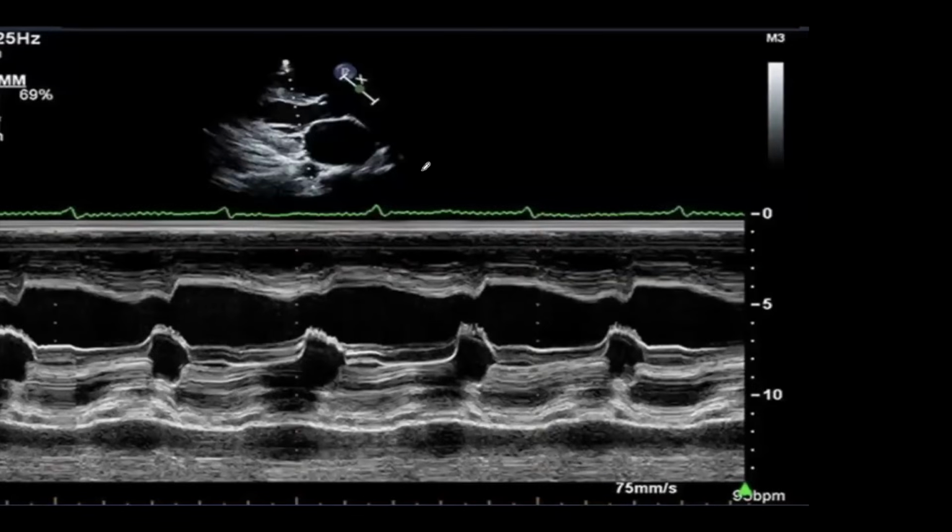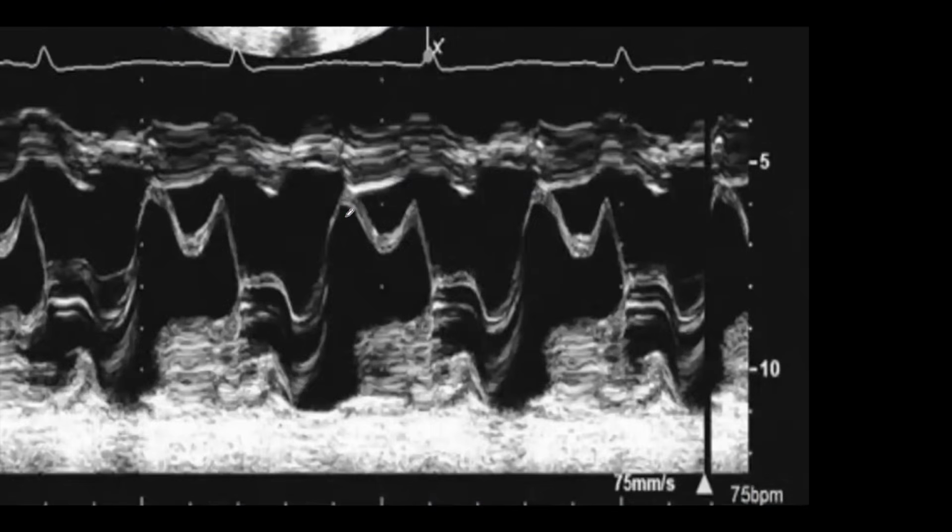So this is the premature closure of the mitral valve. So what will happen? There will be high LVEDP. So the LA is filling and the aorta is filling, and the aortic pressure is higher than that. So if you see here, the valve will close very early. This is a premature closure. This is one of the signs that some of the old folks, I remember, will say, is there a premature closure? If they see this sign, this patient should go for surgery immediately. This patient will not survive.